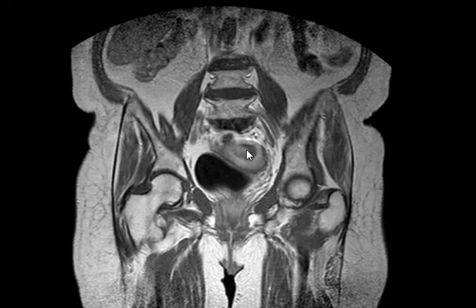Maybe fistula. Why is it not a pedunculated fibroid? Which one? Within the endometrium. The serosal fibroid or the endometrial one? What are you talking about? Which one do you mean? No, the subserosal. Yeah, it is a pedunculated fibroid. It is a serosal pedunculated fibroid. It's not torted, it's just pedunculated.